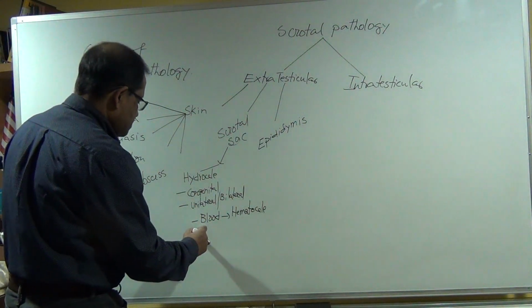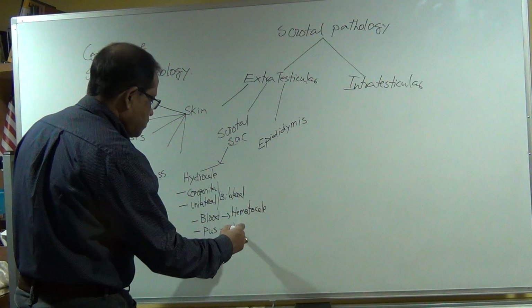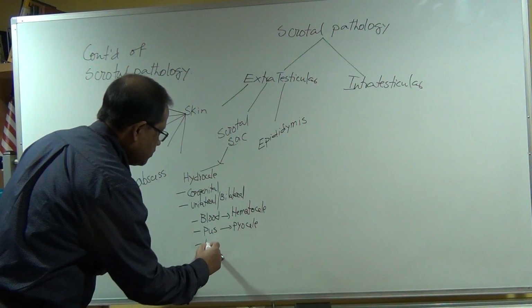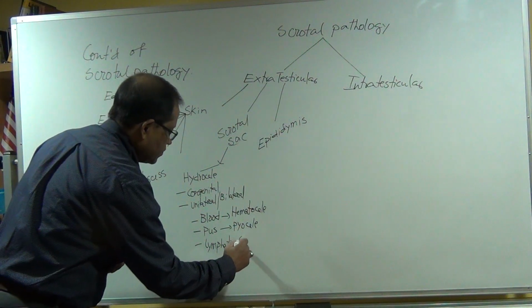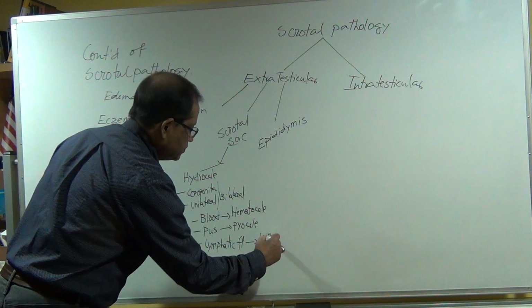If it contains pus, we call it pyocele. If it contains lymphatic fluids, we call it lymphocele.